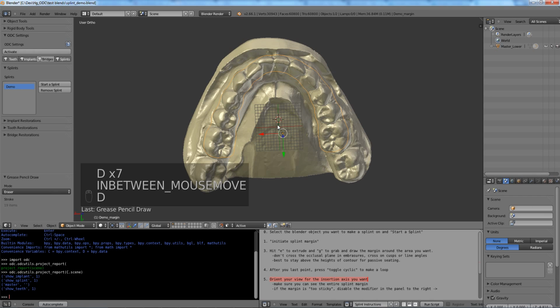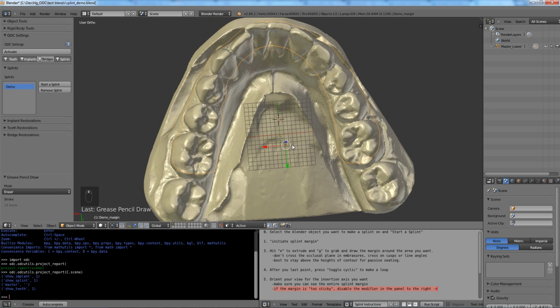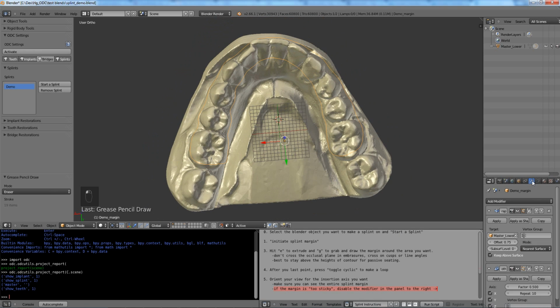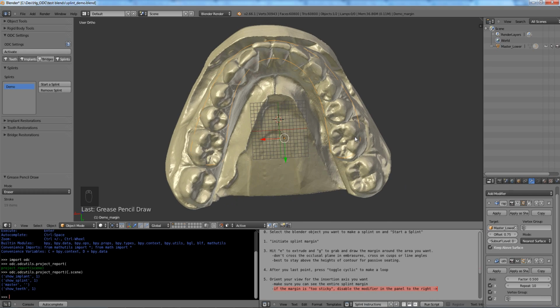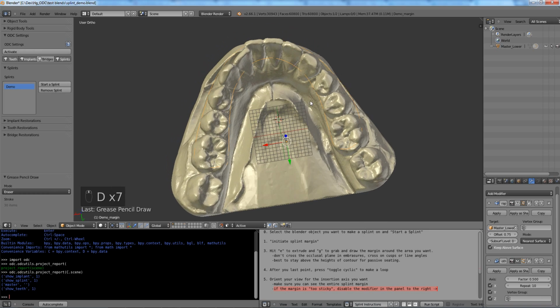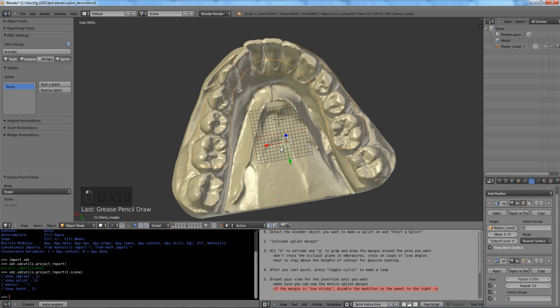And so now, if, for example, you have places where you have an edentulous space and the margin is sticking to the model incorrectly, come over here and you can disable this modifier. Okay, and that'll be fine. This is okay, not a big problem. This is not okay. Okay, so let's leave that as is.